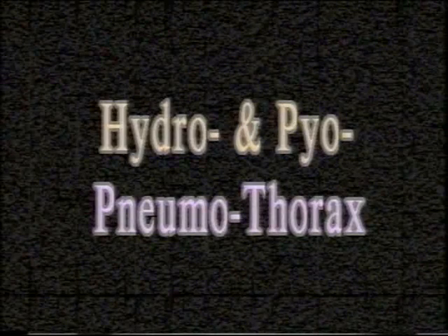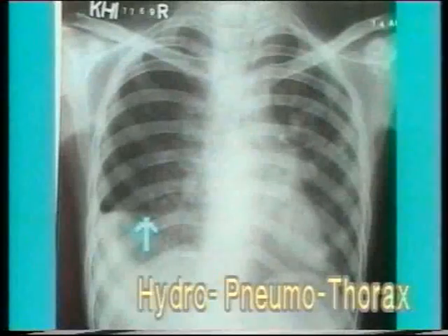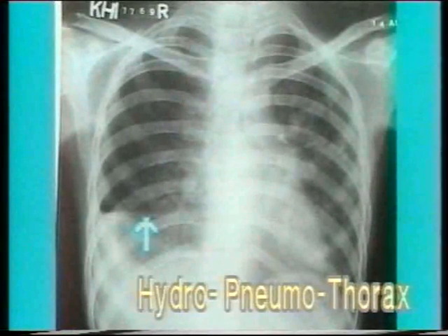Hydropneumothorax and pyopneumothorax. When the pleural cavity contains both fluid and air, the condition is termed hydropneumothorax if the fluid is clear and pyopneumothorax if the fluid is pus.